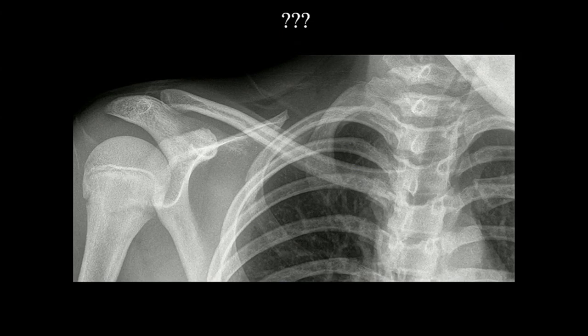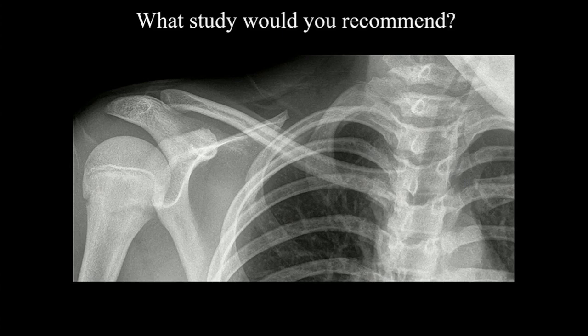So this is the film. This is a clavicle film. Just take a look at this and see what you think. And then, what study would you recommend next to really be definitive or to check for complications of this entity?